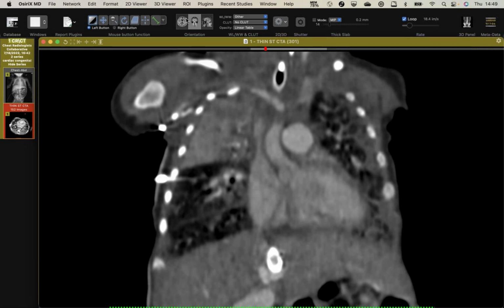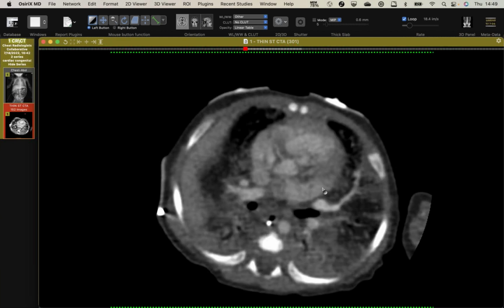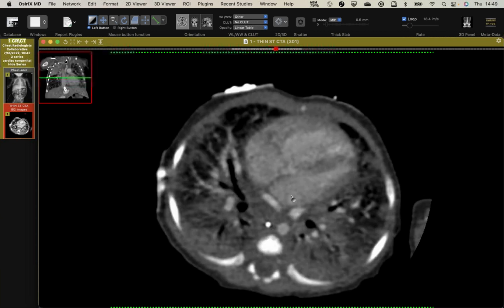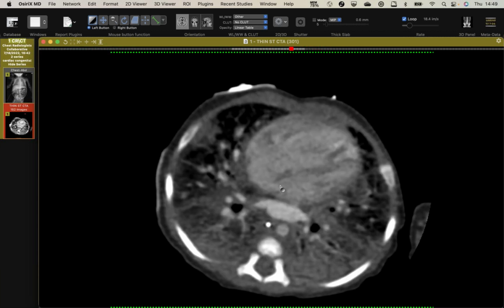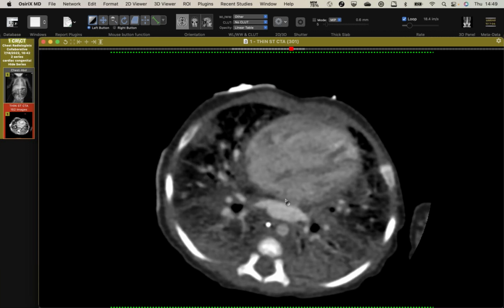I was looking at the veins, but I didn't see how much of a left atrium there was. It's there. There's the appendage. There's a shunt, so that's why it's still intact, right? I presume it's right in that area there. We don't see it. Yeah, there's the ASD right there. There it is, right there. So yeah, it just never attached.